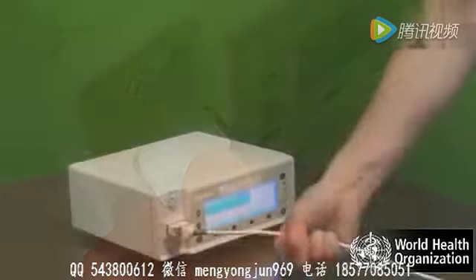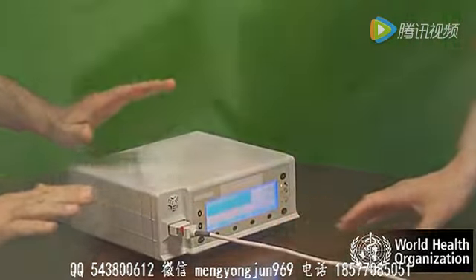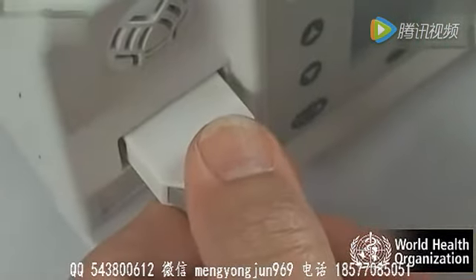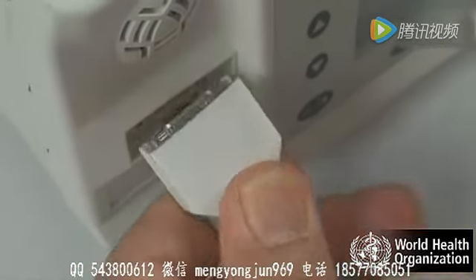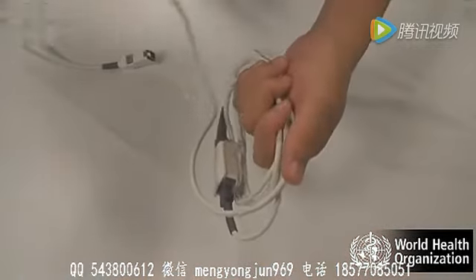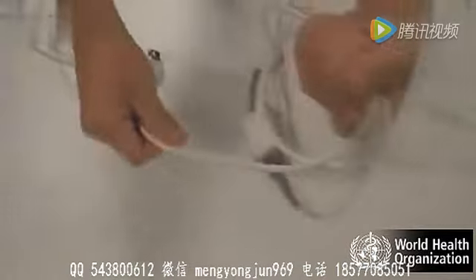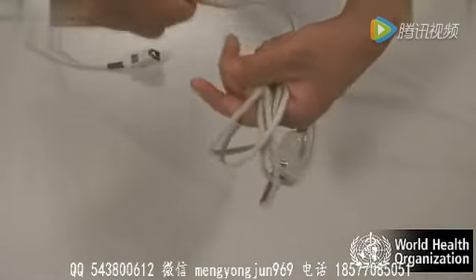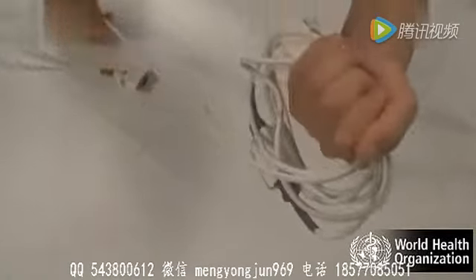Similarly, pulling the probe from the machine by the cable may damage the cord. Therefore, it is necessary to always grasp the connector firmly between finger and thumb when unhooking the probe from the monitor. When not in use, the oximeter probe cable may be loosely coiled for storage or carrying, but should not be coiled too tightly, as this will damage the wires inside the cable.